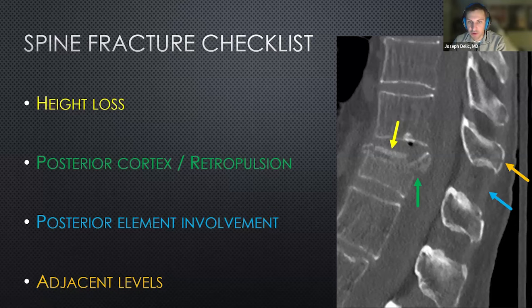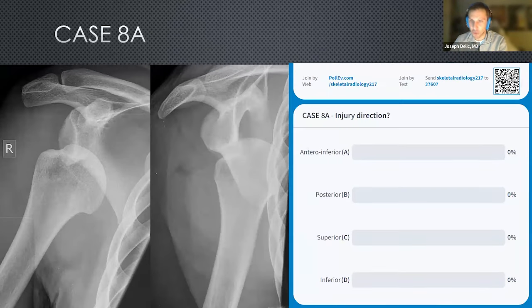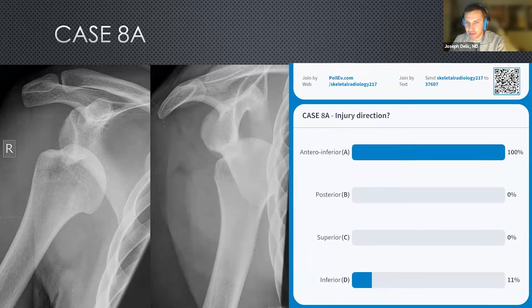All right, so moving on from spine, thankfully. So we have case 8. What is our injury direction? So a common thing we see in the emergency department.